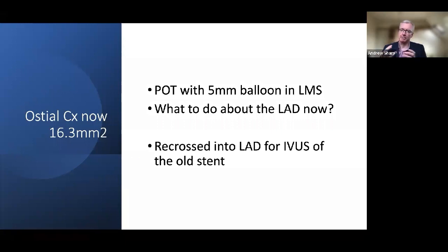So if we take a balloon size just on that slice at the ostium of LAD, where the media to media diameter is 6 millimeters, we could potentially rupture either the distal left main upstream or the LAD downstream. It's 5.5-ish upstream in the left main, it's 4 downstream in the LAD.